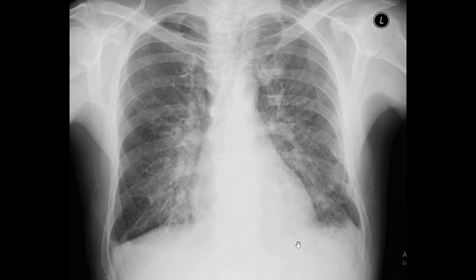Then what is interesting here, if we look closely, maybe it is a little bit hard to see, there are small horizontal white lines here at the basal parts of the lung fields. Maybe they are a little bit harder to see, but they are present, especially this one. And those are actually those Kerley B lines I talked about. They are maybe a subtle sign of pulmonary edema, but in this case we see how this hilum here and this hilum here, they are bulkier and bigger than normal. There is more white here, and they are actually enlarged.